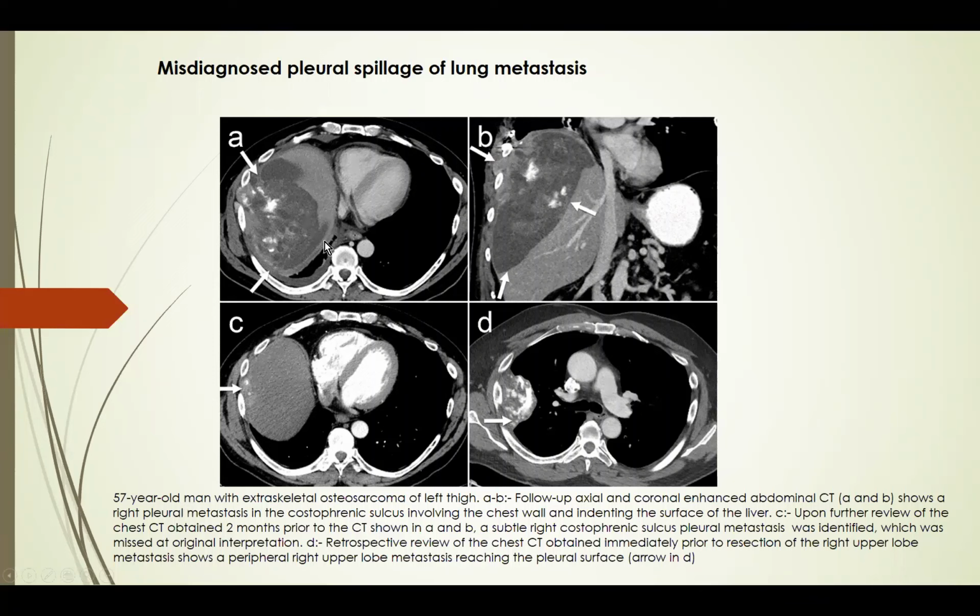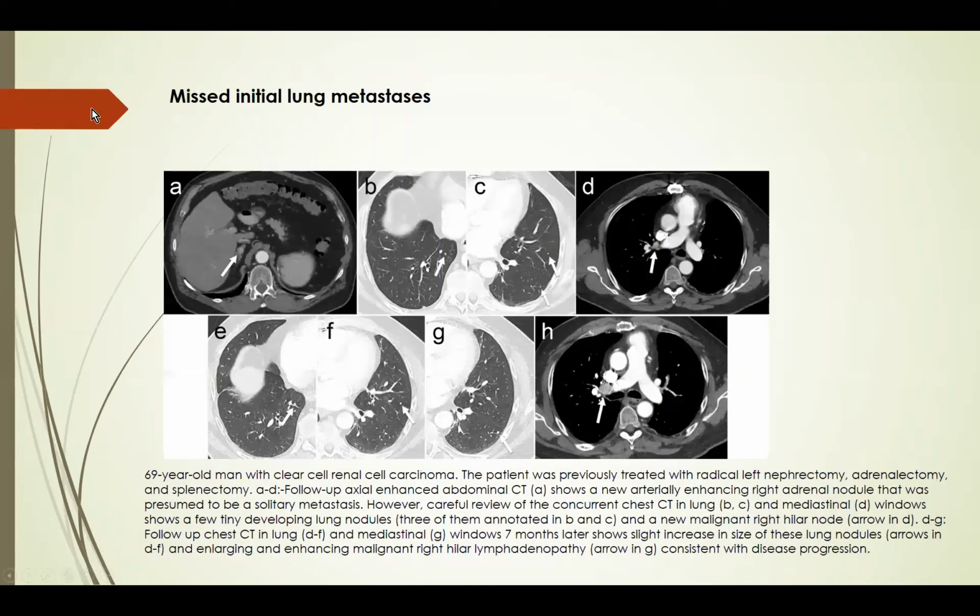If we understand the pattern of disease, there's no way you can call this liver metastatic disease. We would have saved the patient this treatment and this invasive procedure. Whatever chemotherapy was given intraarterially was about as effective as intravenous chemotherapy. So there are real world implications to what we say and what we don't say in our reports.